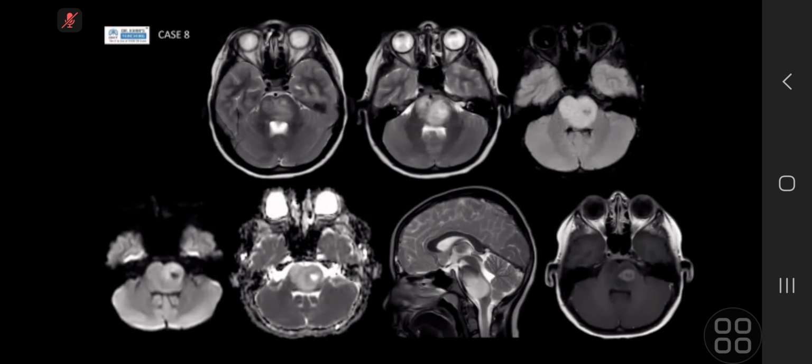I think I will go with brainstem glioma, the first for me, glioma in this region. I am suggesting it could be focal necrosis, something like this, or myelinolysis, something on top of this pathology.